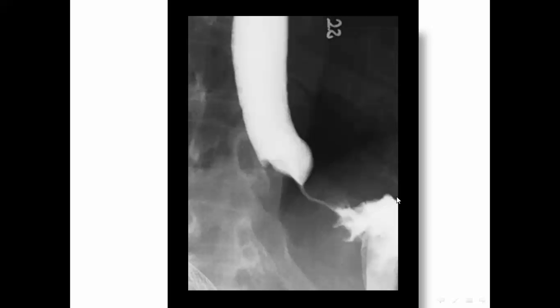There should be coaptation between the diaphragm and the barium filled gastric fundus. The gastric fundus should be here. So there is a large soft tissue shadow here and here and multiple irregularities along the fundus. Short segment of stricture and multiple irregularity along the distal esophagus.